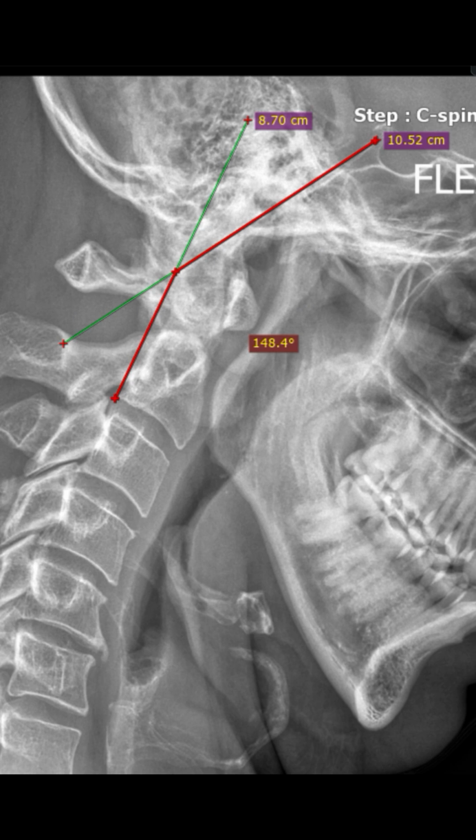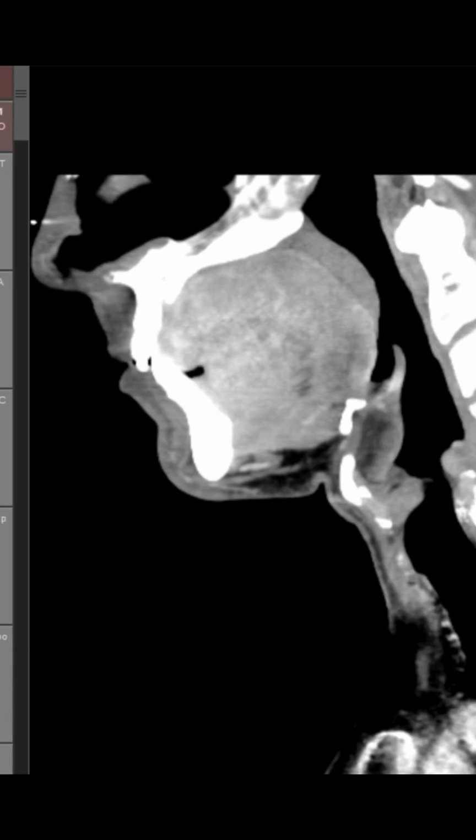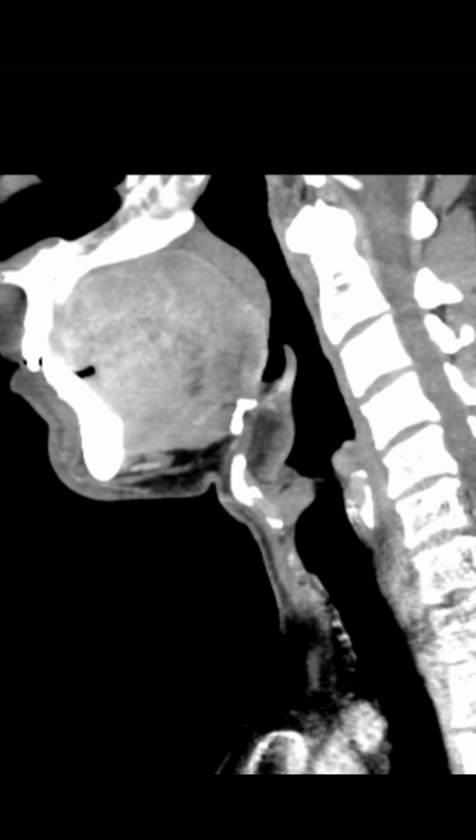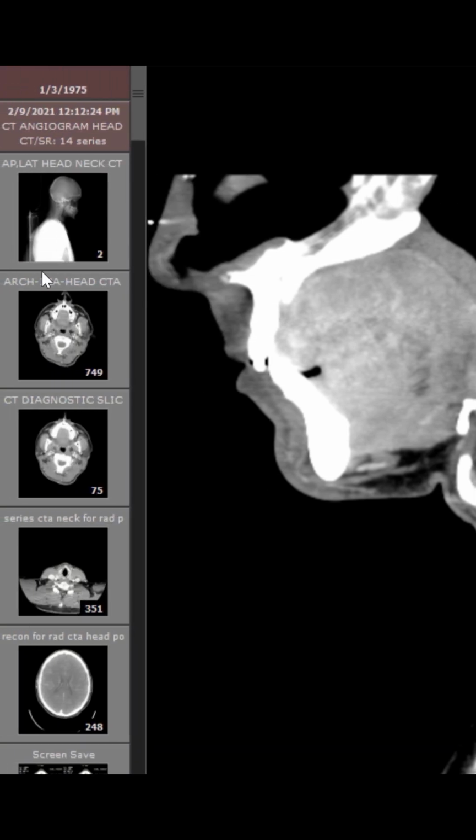And let's see what else we can show you real quick before we close out. Here's an example of problematic. So if you get a sagittal where you never see the clivus at all, switch over to, just making sure there's no patient data here.